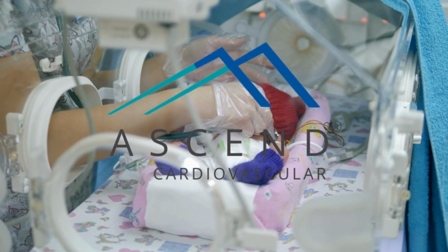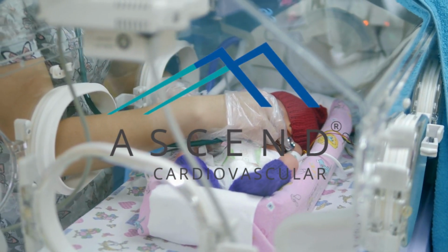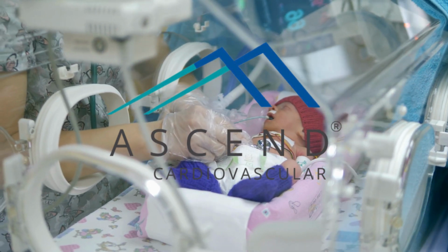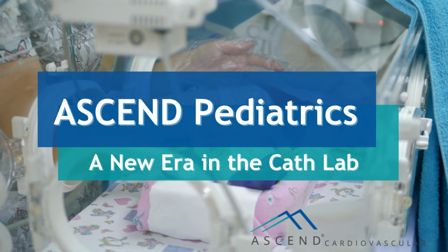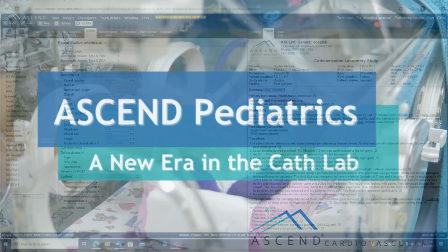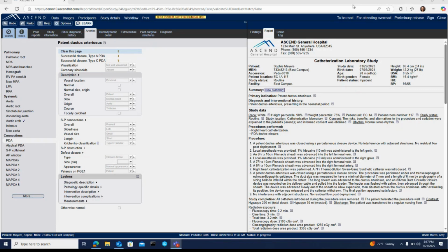Introducing Ascend Pediatrics, a bold step forward in congenital heart disease management. Built for the enterprise, it delivers precision, clarity, and control. Cath reporting hasn't kept pace until now. Modernized intelligent features are unlocking a new era in the Cath lab.